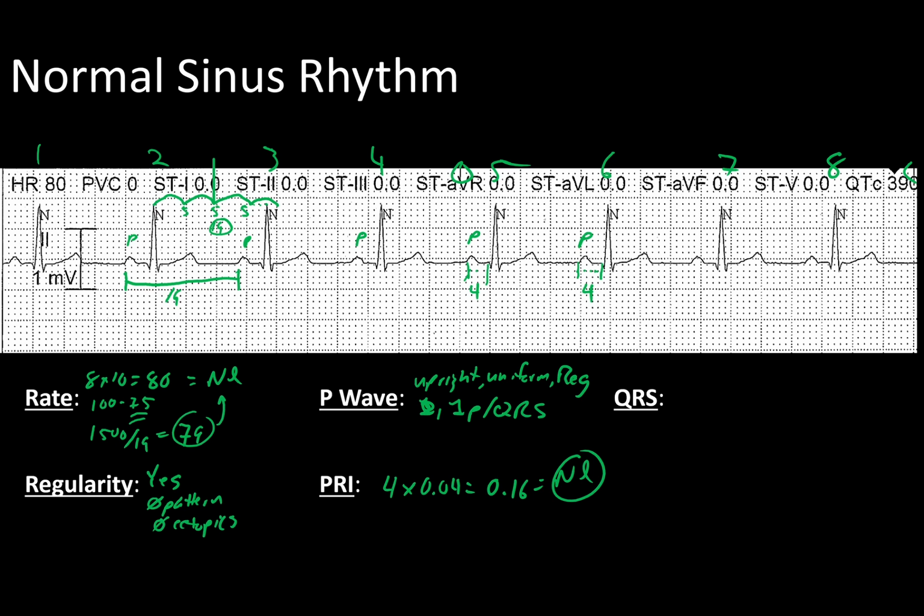And finally our QRS. Just looking across the screen, you can see that the QRSs are uniform. And they have the QRS pattern.